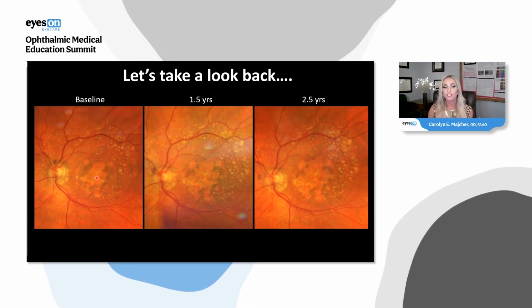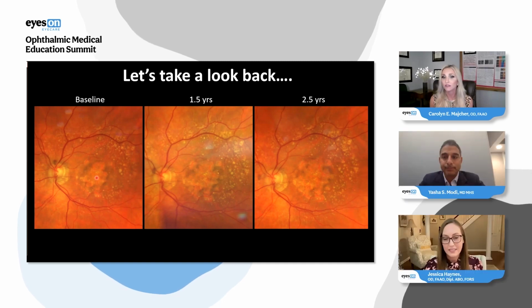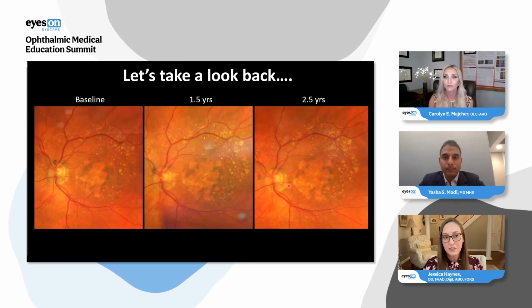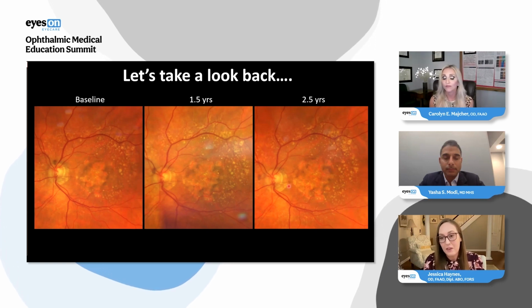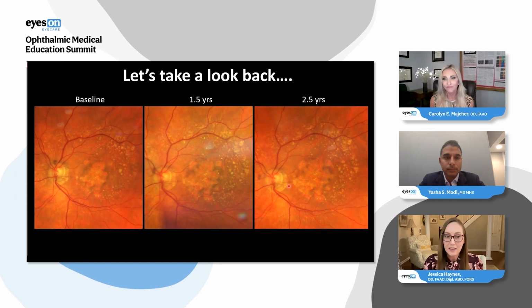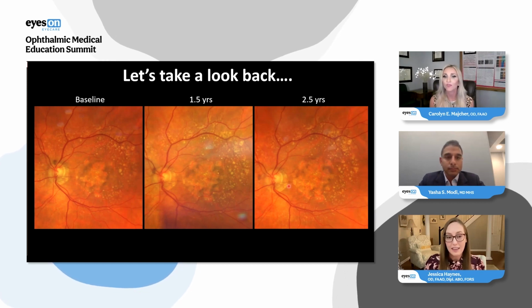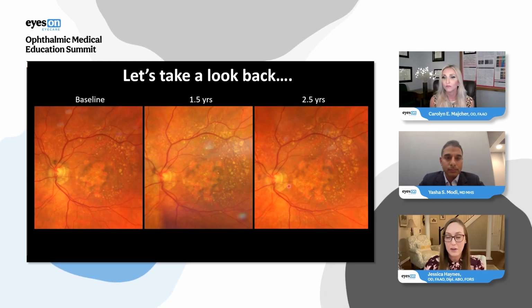Do you think, based on the color fundus photography here, that there has been progression over time in this eye? Yes, this patient definitely looks like they have gotten worse from baseline over the last 2.5 years. One interesting thought on treating patients like this who are already center involving is that even though the visual acuity may not change as they progress, the size of that scotoma increases over time. So is there some value, and Yasha may speak to this, in still treating these patients to try to control the size of that scotoma?